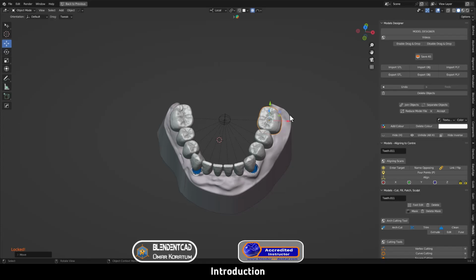So in the following part of the video, we'll see how to create this master tool, and then how to lock the other objects in the scene to prevent them from moving, and to get the full functionality of this chain mode from Exocad in Blenderfordental.